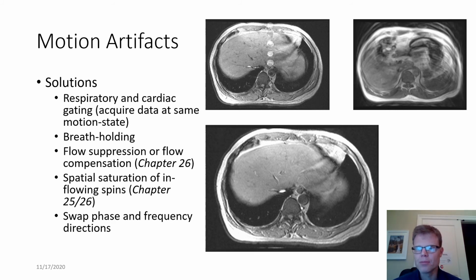And on the top right, this is a similar location in the abdomen, and this is a respiratory motion artifact, a little bit less periodic, or maybe some irregular breathing. So you get some semblance of these periodic ghosting features here, but a lot more of a diffuse artifact. And then pointing out these are the ghosts originating from this signal source right here.